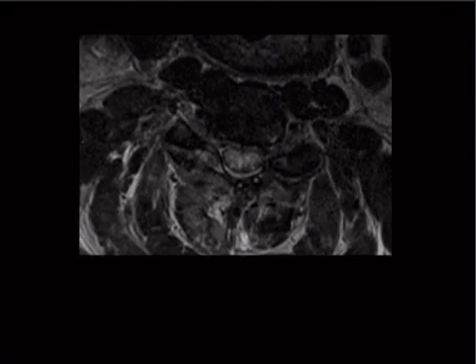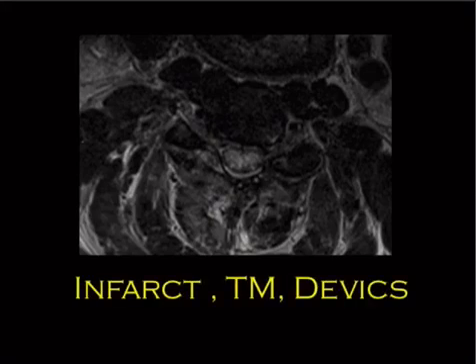All right, and then this is the last one that I think is the classic look. So it's the whole enchilada that's involved, like the whole cord was whited out. So ischemia is the one I always think about. Transverse myelitis too, because it's like, transverse. And then Devic's, neuromyelitis, it's the optic nerve as well as the transverse myelitis of the cord.